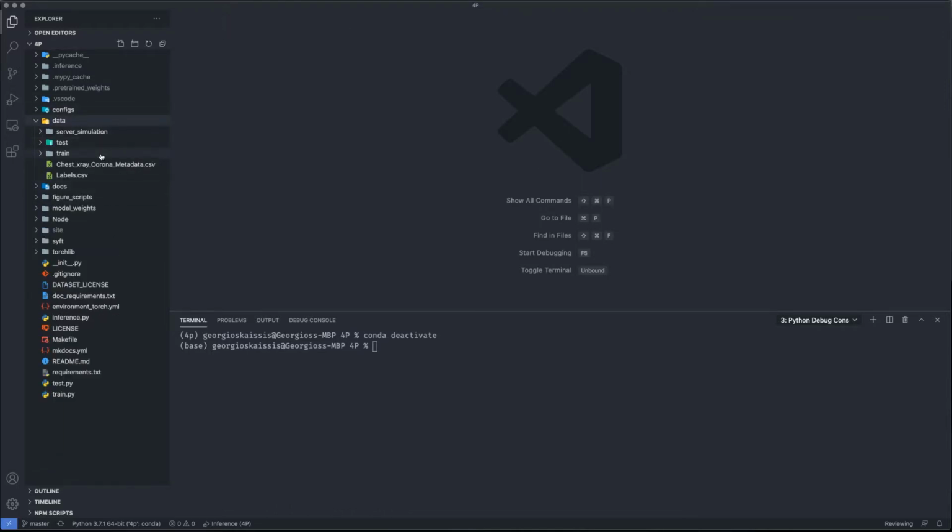The data directory holds all the data from the pediatric pneumonia dataset. That's the dataset we use to do the case study that we're showing in our publication, and that's provided alongside the repository, so you can actually use some real-world clinical data, some real medical data to do your experimentation. PriMIA is designed to do experimentation on your local computer, but it scales up quite seamlessly to cloud environments, and you can do training over the web, and I'll show you how to do all of that.